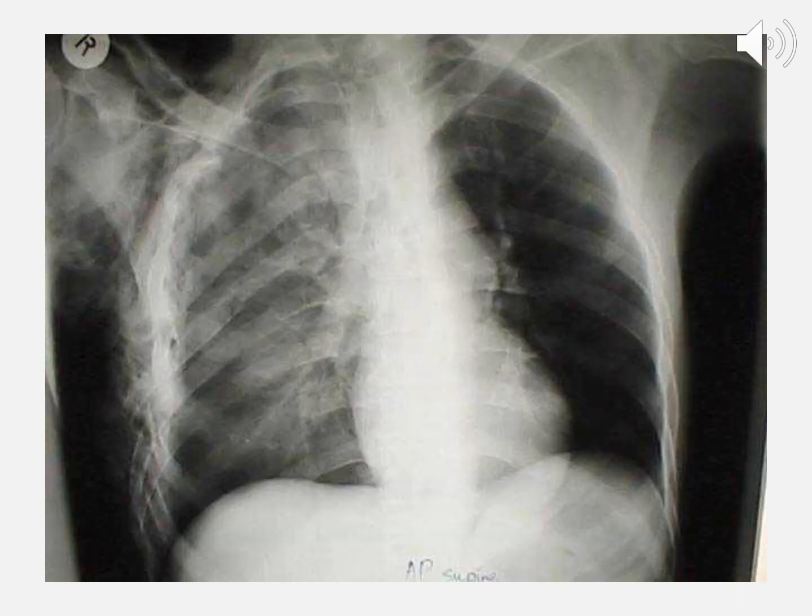More pneumothorax. You can see this one on the left side. Don't see much lung markings at all. Hard to see a border. Looks like a tension pneumo. There's some tracheal deviation. This patient is rotated as well. Obviously a trauma patient. Look at all that on the right side. It looks like there's some air in the soft tissues and other things going on. But anyway, this is an AP supine pneumothorax.